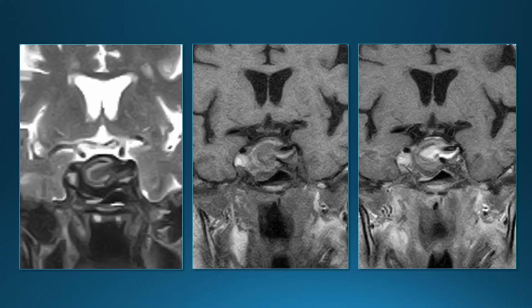Here's another aneurysm. This one shows a funny lamellar kind of appearance. When you see this laminated appearance, think aneurysm. That's from clots of different ages causing that laminated or lamellated appearance.